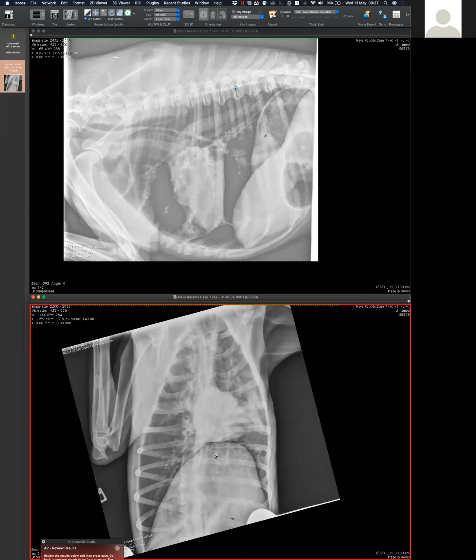Mariano, my question was, if you have a pneumothorax and the heart is kind of tilted down, can that make it look small when the dog's not hypovolemic? Good question, and I don't know the answer, but it's a good thinking. I suppose it can make it shorter for sure, because when you put the dog on the side, basically the heart is kind of laying on the lung, and that's why you get that length of the heart.